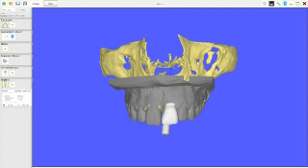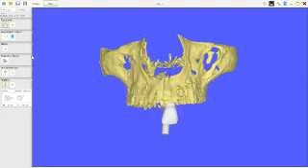And one of the things we can do is switch things on and off. So we can look at how the image looks. Now, what we've got here superimposed is an STL file which represents our stone model. So I'm going to switch that stone model out, and to do that all I need to do is go to this imported object and click onto this little thing that looks like a speaker. Just click on that and the model's gone.